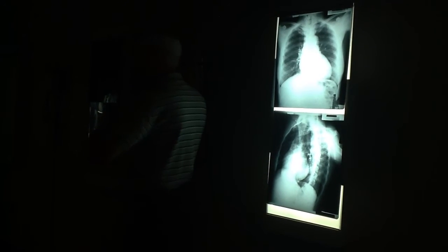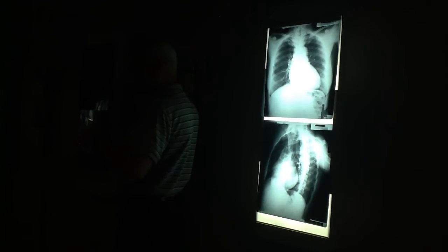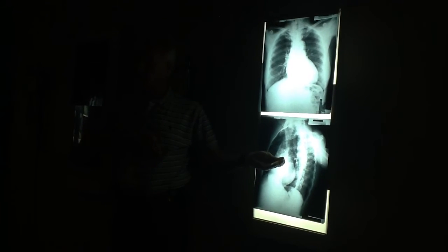When you go this way, the beam sees it straight up and down. It's not straight up and down, but the beam sees it straight up and down. The beam sees it this way. It's sitting this way, but the beam can't see this because the beam's coming straight through it this way. So this is an LAO.